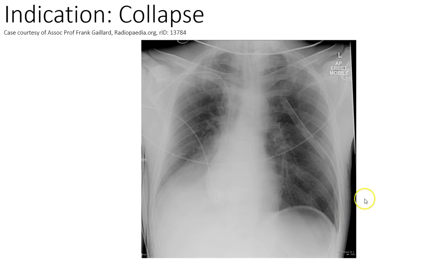On this chest X-ray, okay, this is an example of atelectasis or collapse. When you think about how you describe things to patients, just throwing this in there, probably the worst thing that you could tell a patient is that their lung has collapsed. It brings up all sorts of images for patients of things inside their lungs that aren't necessarily helpful. I think what's more useful is to describe it as being deflated, like a balloon. Your lungs are deflated and we need to reinflate them. It's a less alarming way of putting it, and something that they can easily understand.